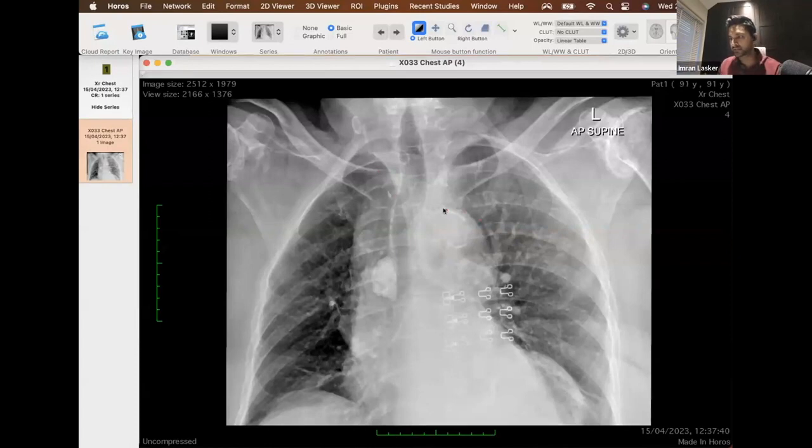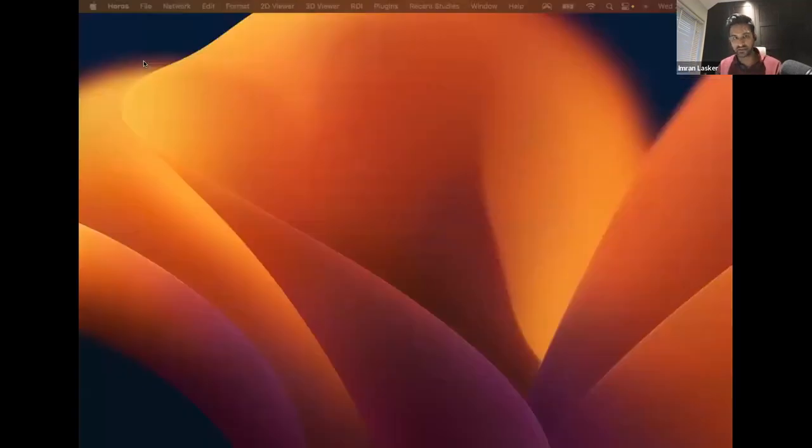And for those that want a little bonus point, you can see there's a little bit of atherosclerosis sitting within that aortic knuckle as well, but no widening of the mediastinum per se. I know someone said widening of the mediastinum, but you also have to remember this patient's rotated, so you're seeing them at an angle anyway. Look where that airway is compared to the rest of the aorta over there. You're seeing it in this rotated position, which means that the mediastinum is naturally going to look a lot wider than it otherwise would.